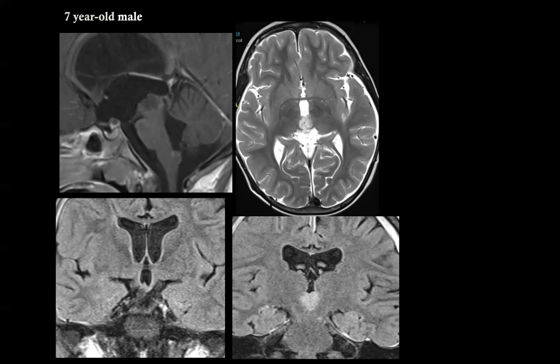What do you need to distinguish this from the other? Well, enhancement can help, but enhancement, remember, can have a lot of problems related to the technique. So when you acquire and which kind of technique you acquire, if it's a gradient echo, MPRAGE, a spin echo, a SPACE, MT, and so on and so on. But when it comes to pediatric tumor, trust the diffusion first.